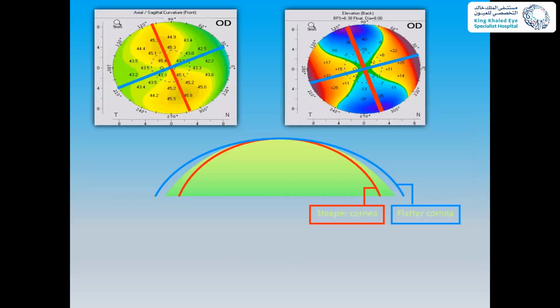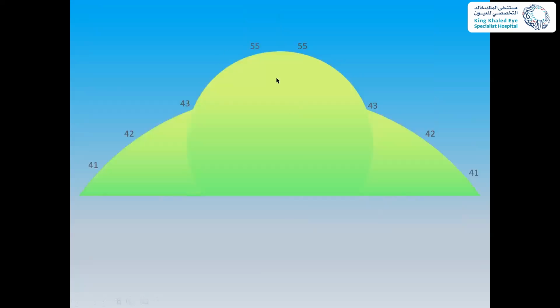Basically, it's very simple. We all know that the peripheral cornea is flat and the central cornea is steep, okay? So if you use all of the cornea at 12 millimeters, it will become flattish, isn't it? If you use less cornea, the best sphere fit will be low, okay? But there's another problem. This is a normal cornea, but the problem in keratoconus is something like this.